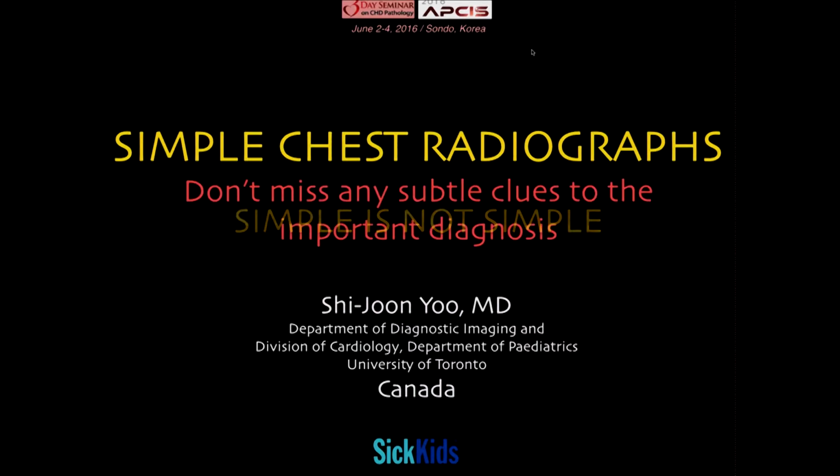So what I wanted to talk about today is plain films. What you usually do is see your patient, see how big the heart is, what the pulmonary vascularity is, whether there is any pulmonary edema, and whether there is any rapid change in heart size. However, if you look at the plain films very carefully, not infrequently you have quite valuable information. I want to focus on those small issues.